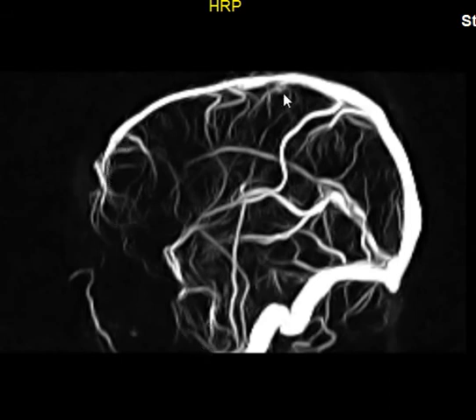Again, the superior sagittal sinus. Now, these are superficial veins joining the superior sagittal sinus. I don't know the names of the cortical veins, and I don't really care about them much. Anyway, so the superior sagittal sinus, the inferior sagittal sinus, the internal cerebral vein, and the basal vein of Rosenthal joining to form the vein of Galen, with the inferior sagittal sinus forming the straight sinus that joins the superior sagittal sinus, forming the transverse sinus, the sigmoid sinus, jugular bulb, and internal jugular vein.